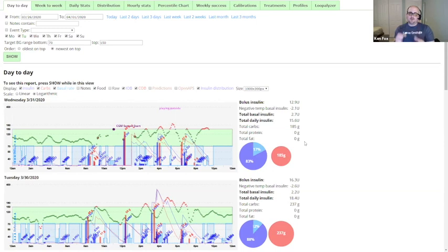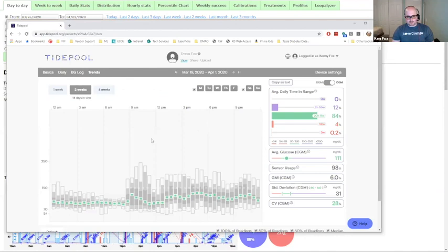So if you want accurate numbers in terms of what your total daily dose is, which is actually a useful number, right? And bolus basal balance, you need to go somewhere else, to Tidepool, because the data gets logged into Apple Health and goes from Apple Health to Tidepool. So Loop is logging exactly how much is delivered in those basal rate changes, even if it's nothing. But Tidepool has that information. So it gets it from Apple Health, and so where is it?